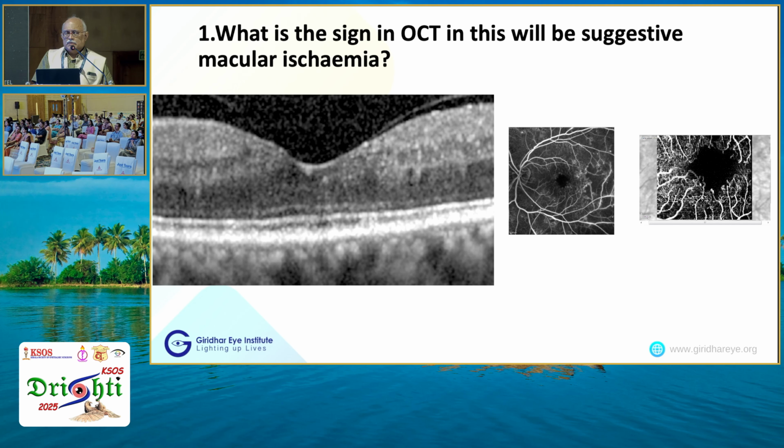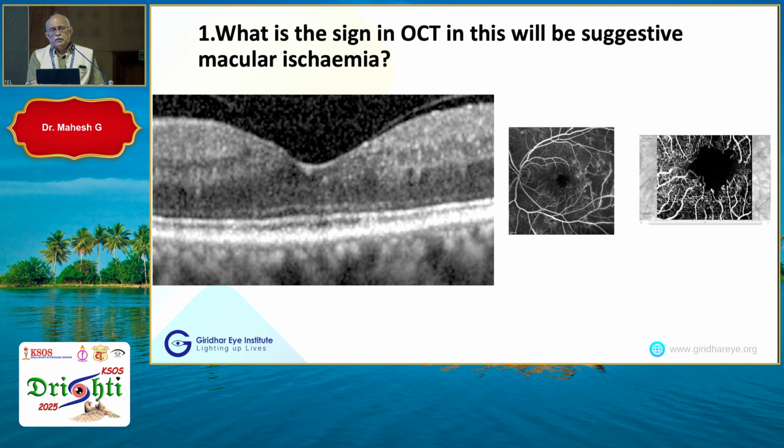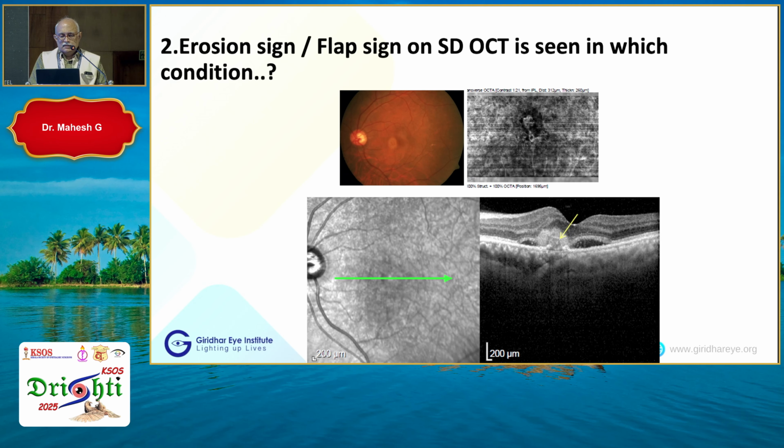First of all, when you take an OCT test, please look at the black and white picture, not the color picture. The green one will not give this much clarity. It is very difficult to trace in a pseudo-colored picture. So look at the black and white picture and always see multiple layers. That is one advice. Don't look at one printout; a lot of people are treating many diseases just with the printout. Just like our glaucoma colleagues say, don't treat based on one picture only. So that is the drill.